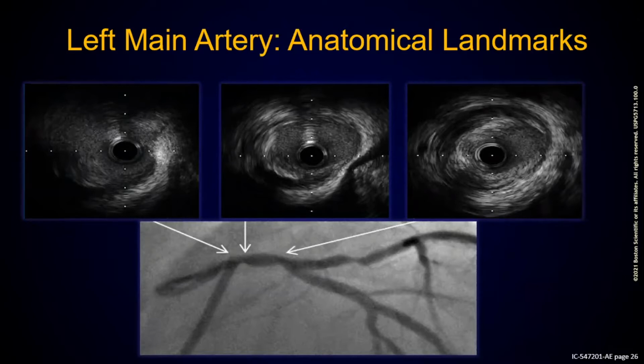This is very clearly demonstrated. This is the ostium. The ostium of any artery, whether it's the left main stem or the right coronary artery, is part of the aorta as well. That's why we call it an aorto-ostial lesion. I don't want to go into details. What are the other significances of an aorto-ostial lesion? The majority of us would know about that. So this is part of the aorta and part of the opening of the left main stem.